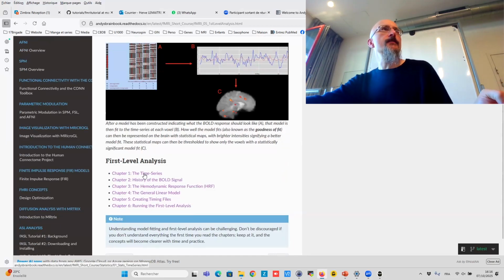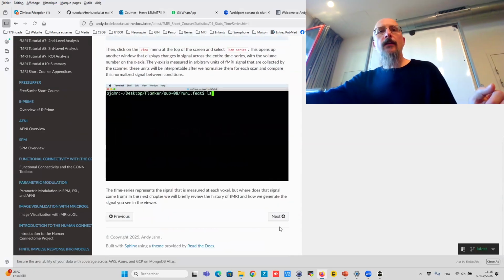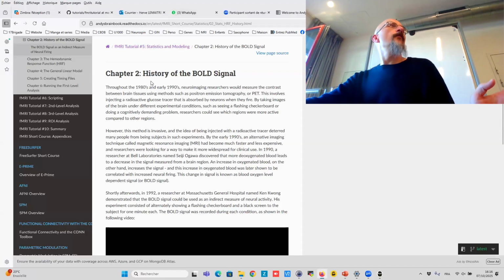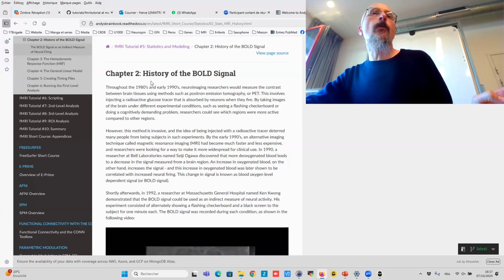So first level analysis. Let's do some statistics. Yes, it's a time series. Okay, so we got it. That I don't need. I will not go over the bold signal. This is what we got as signal. It's the BOLD, blood oxygenation level dependent signal.